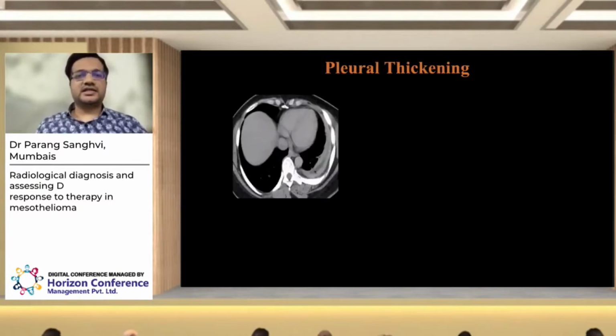If you see, this is an enhancing pleural thickening on the left. You see some effusion also. But this is just about a centimeter in size, and there is no nodularity. Plus you can appreciate the changes of chronicity: contracture of the hemithorax and volume loss. That suggests it has been around for a long time. You might even see calcification along with volume loss and other signs of fibrothorax, which are present in this case as well. So this is the typical presentation of a benign pleural thickening.